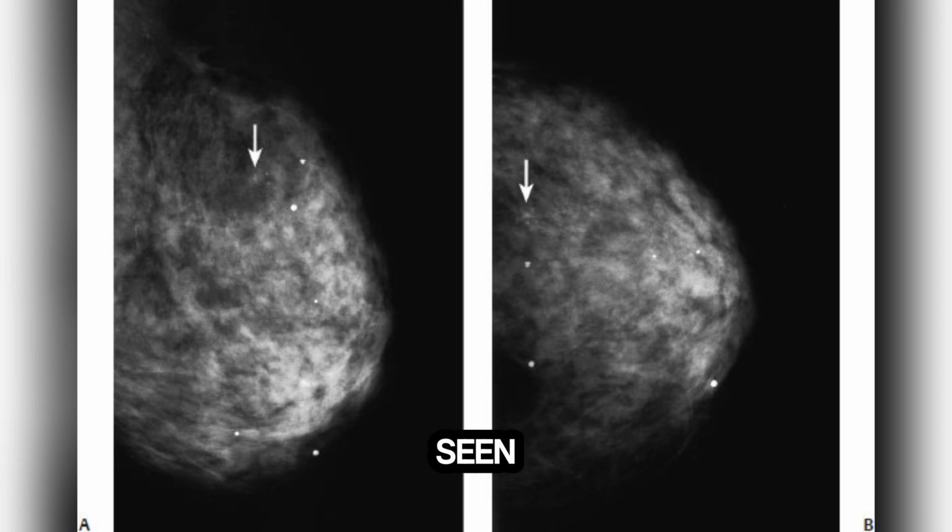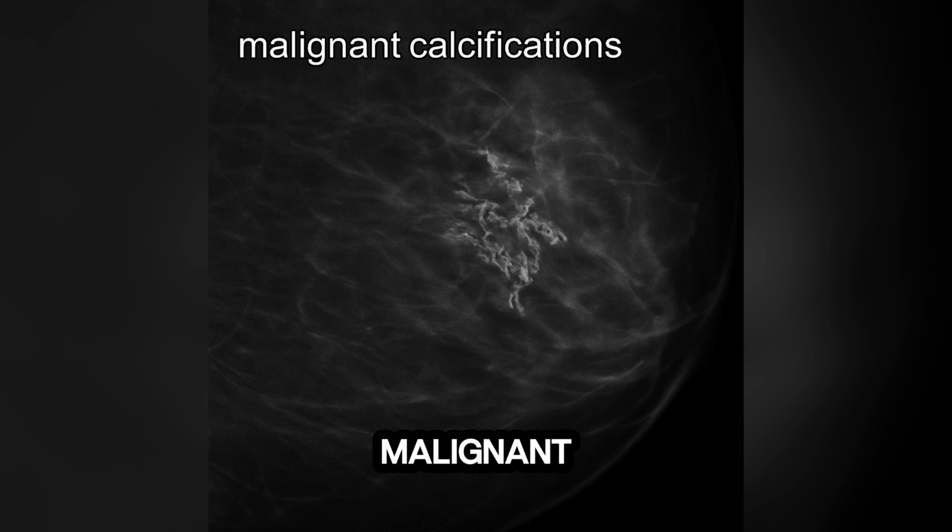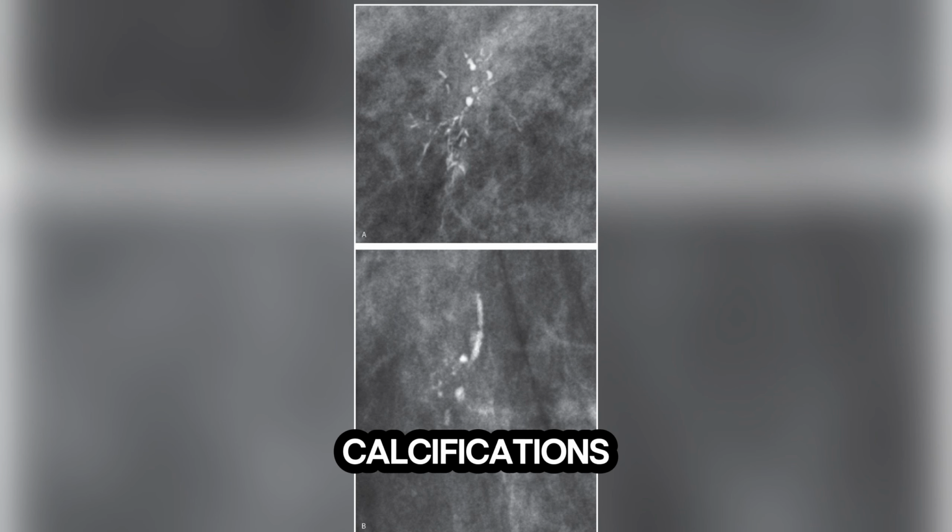Another type of benign calcifications is the popcorn type. As we can see, the faint coarse calcifications are present in the upper outer breast, illustrated by arrow. Follow-up mammogram was performed 3 years later, showing the calcifications, arrow, have enlarged and are now characteristic of an involuting fibroadenoma.